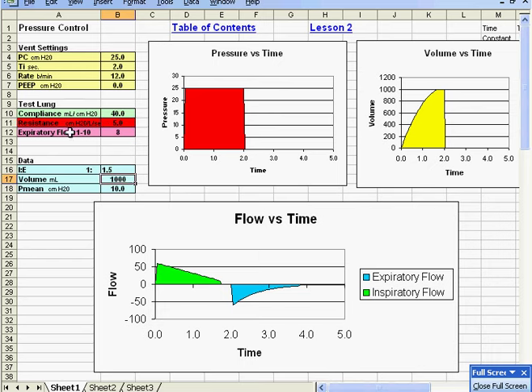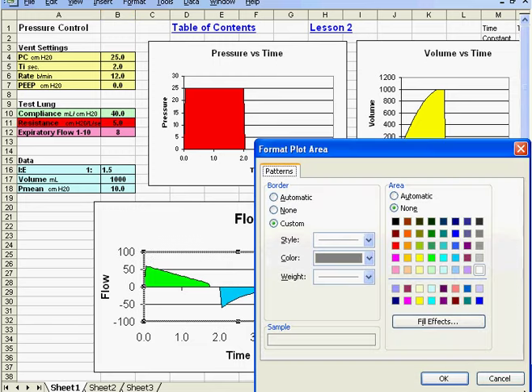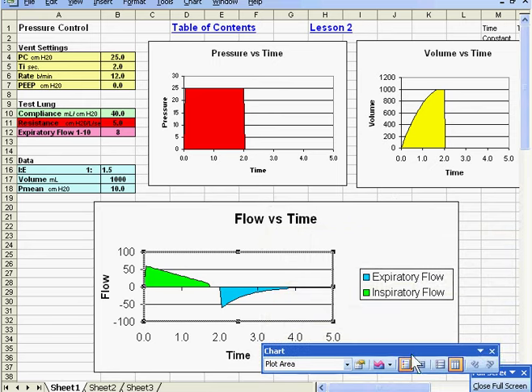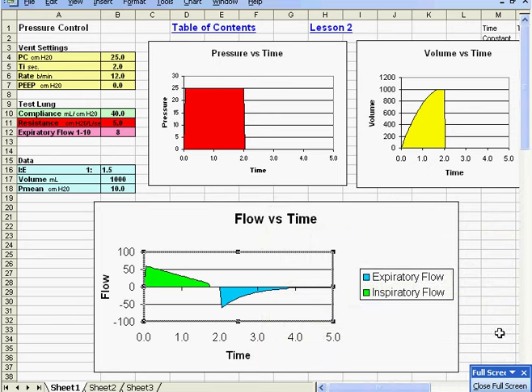So these are the interrelationships we need to look at. Interestingly enough, if we have an inspiratory pause there, what you'll see in this part of our graph right here is almost no effect of resistance. If I decrease the resistance or I increase the resistance, there's no effect because I have this inspiratory pause occurring.